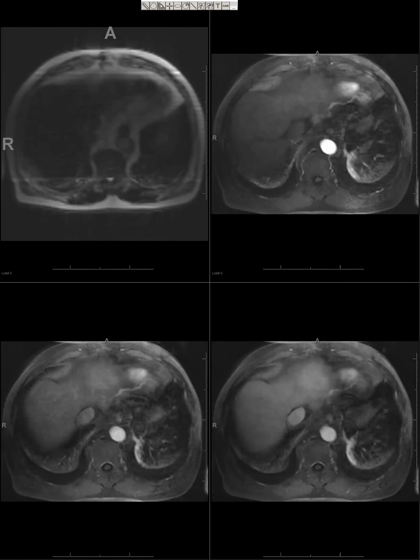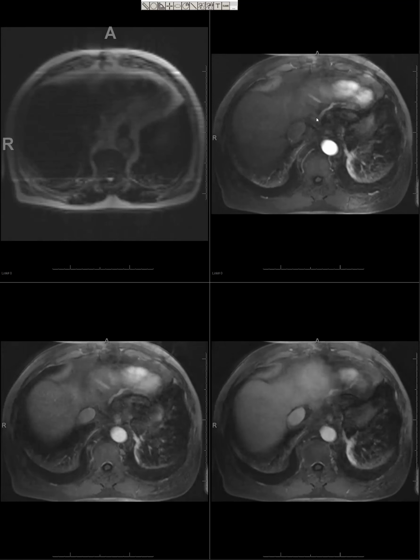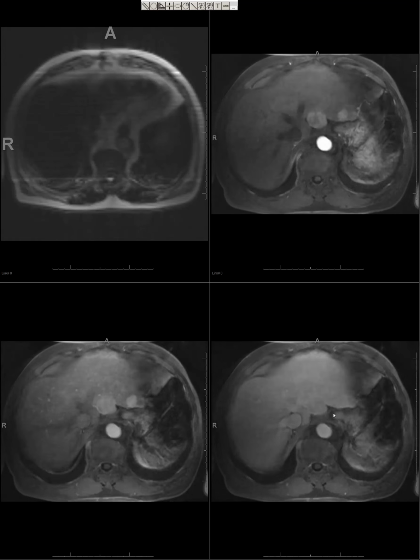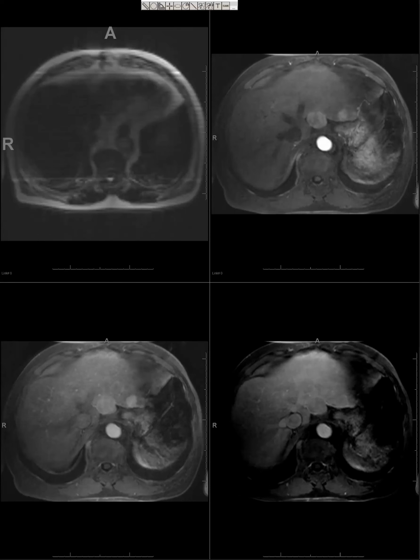Yeah, especially since he has liver disease. Exactly. You see these things and you're going through your LI-RADS stuff, right? Technically this would be LI-RADS 5, enhancing and washing out in background liver disease. It's non-rim arterial phase hyperenhancement, two lesions, left lobe. And then on the delayed, I think I got the delayed here somewhere. That's about as delayed as I get. But it does more or less wash out if you do an extreme windowing here. You can almost see an encapsulated appearance on that one.